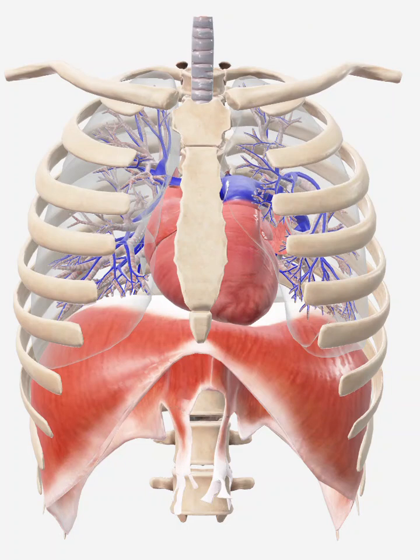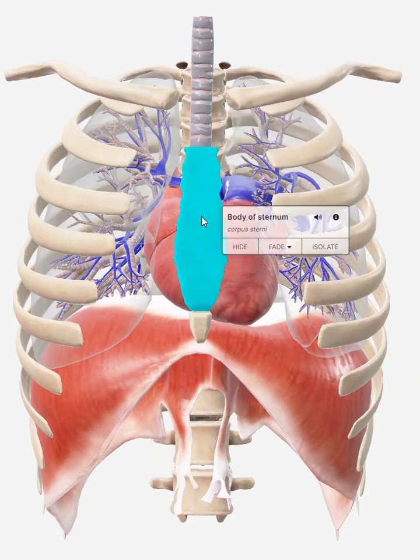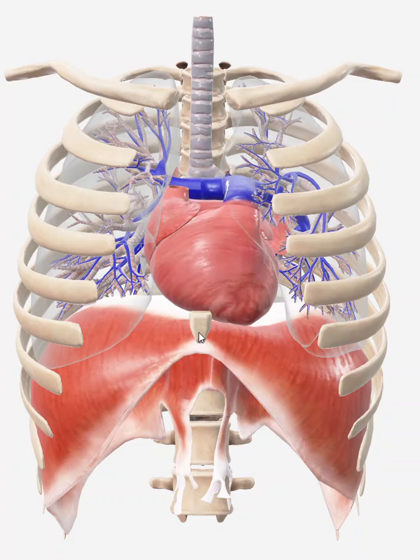I'm going to highlight the different pieces of anatomy that we're looking for on this chest x-ray, and that way we can compare the way it looks anatomically and the way it looks radiographically. First thing I'm going to do is hide the sternum, because if you look at the chest x-ray, you can see that the technique is set so that the sternum, because it's such a small, flat bone made mostly of cancellous spongy bone, gets penetrated and doesn't show up on our chest x-ray, which is fine with us because that's not what we're looking for. We're not looking for bones, right?